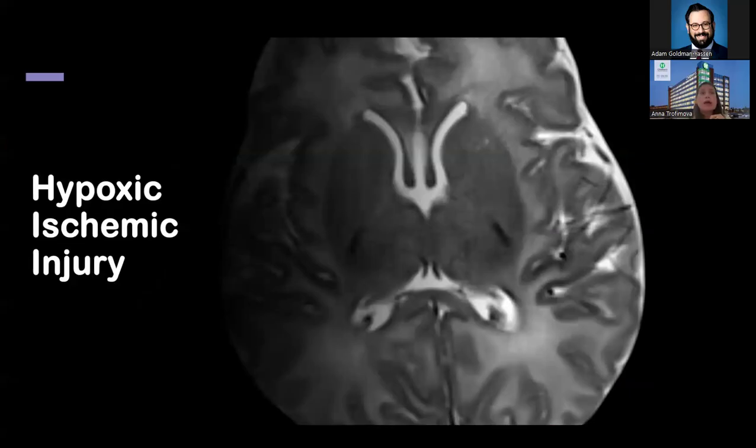Okay, well, hopefully this was helpful, just a brief discussion and reminder of the normal appearance of the neonatal brain. And with that, I think we're now ready to transition to the discussion of our first topic, which is hypoxic ischemic injury.